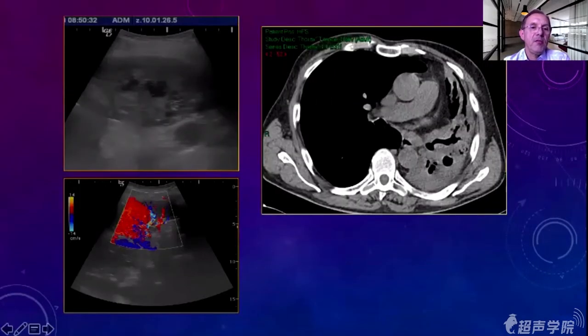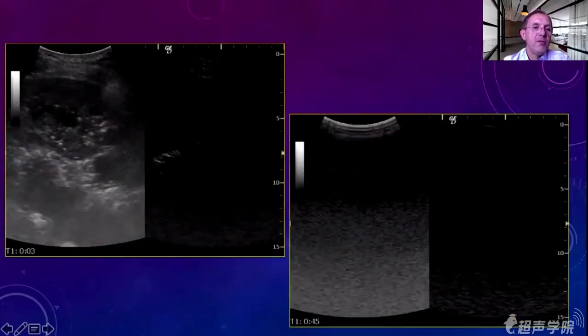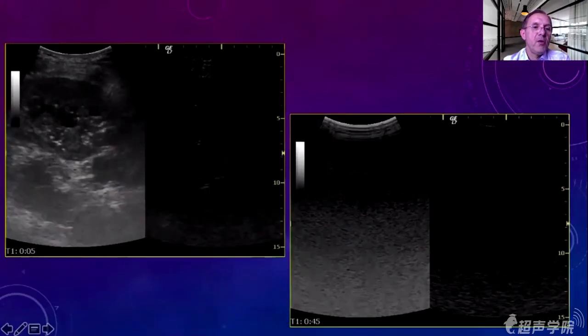Another interesting case of a patient with important productive sputum, and this is the CT picture, and here these liquid areas inside the consolidated lung. In fact, there were very large bronchi in a patient with bronchial disease. And here also you see very well the fluid in the bronchi.